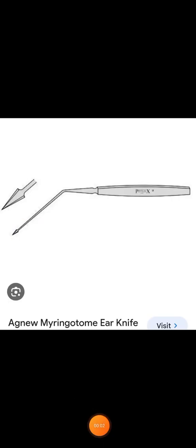Assalamu alaikum. In this video, we are going to discuss the ENT OSPE, and this is my second video on ENT OSPE. In this video, I am going to discuss the ear instruments. So let's start with the first instrument in front of you.